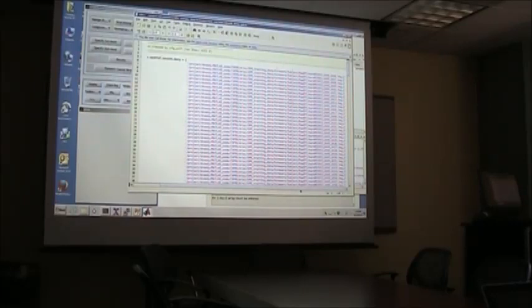You could use find and replace to get rid of any of the subject-specific information, replace that with another subject, save that file again, and then run that file. Does it make sense? In that way you can bypass the whole user interface of SPM for running your processing.